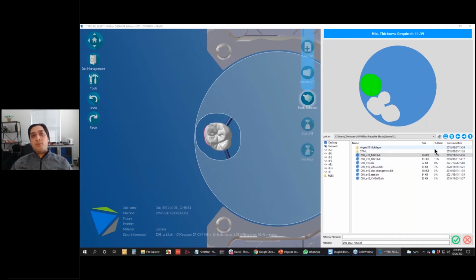Now, the way that my partially used discs are held in memory here is they're stored in descending order based on the percentage of how much of that disk has been used. So you can see down here, this disk has only been used by 3%. And we show the disk that has the highest utilization up at the top. Now, why do we do that?